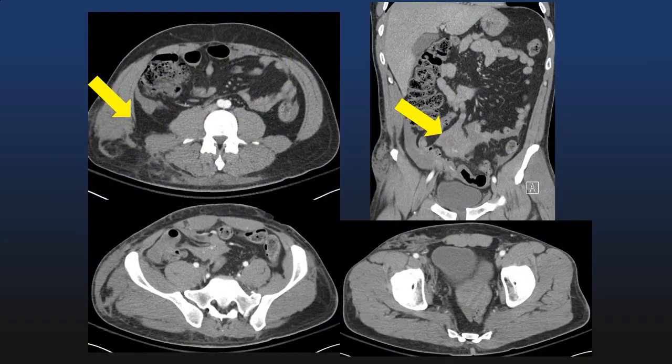Well, here's another case of an abdominal wall hernia, in this case posteriorly. This is also different in the sense that this was an acute presentation. This patient was in a motor vehicle collision. So notice that the patient has a right-sided traumatic inferior lumbar triangle hernia. There's also mixed attenuation material within the small bowel mesentery and surrounding multiple bowel loops, as well as within the pelvis, with perhaps a focus of active extravasation in the small bowel mesentery. So this is a traumatic lumbar hernia associated with bowel injury and hemoperitoneum.